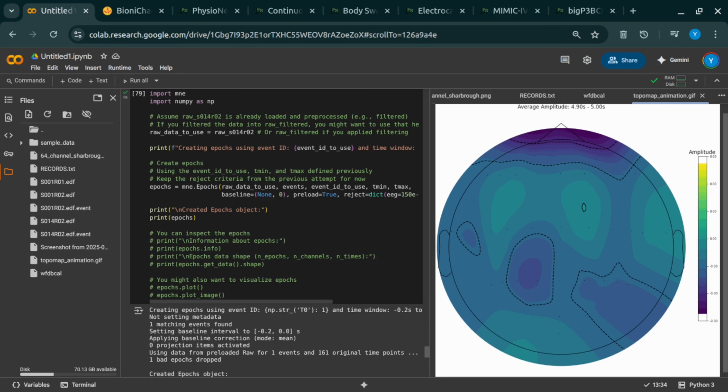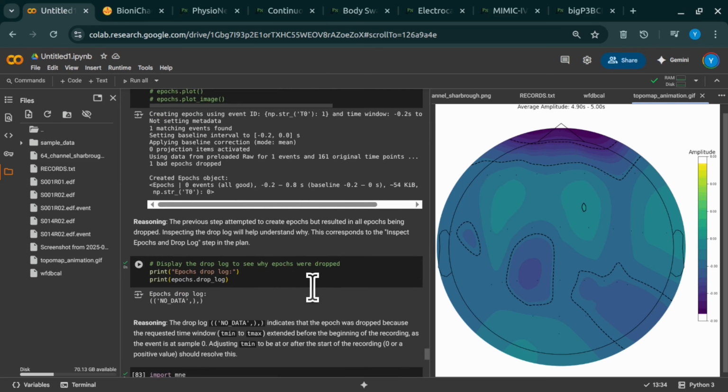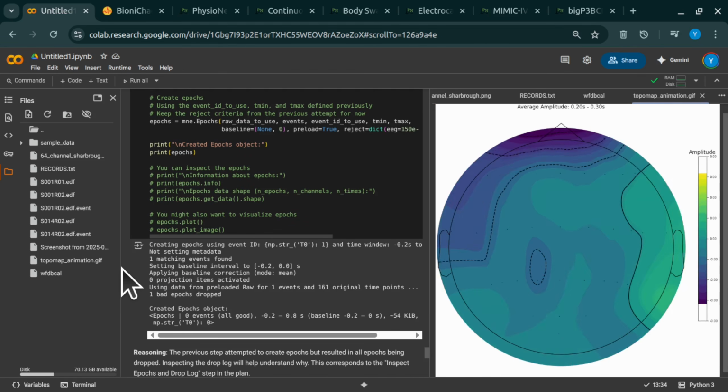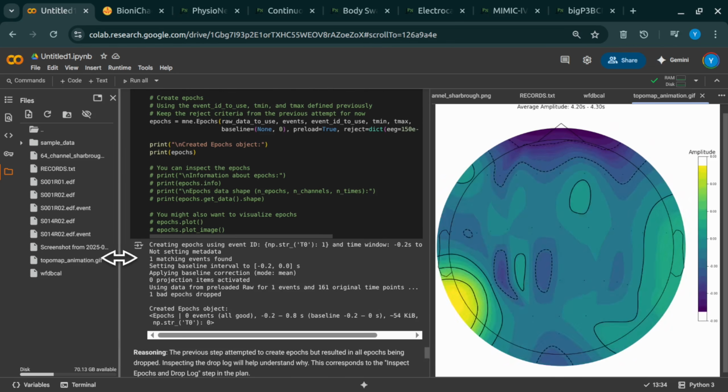Think of them as 2D maps of the scalp. Okay. And colors spread across this map show where the electrical signal is strongest or weakest at one specific instant in time. It's like a heat map of brain activity. Really intuitive. Cool, so you can see patterns, like maybe activity is strong over the motor area. Exactly, you can see the spatial distribution, but we didn't stop at just static pictures.